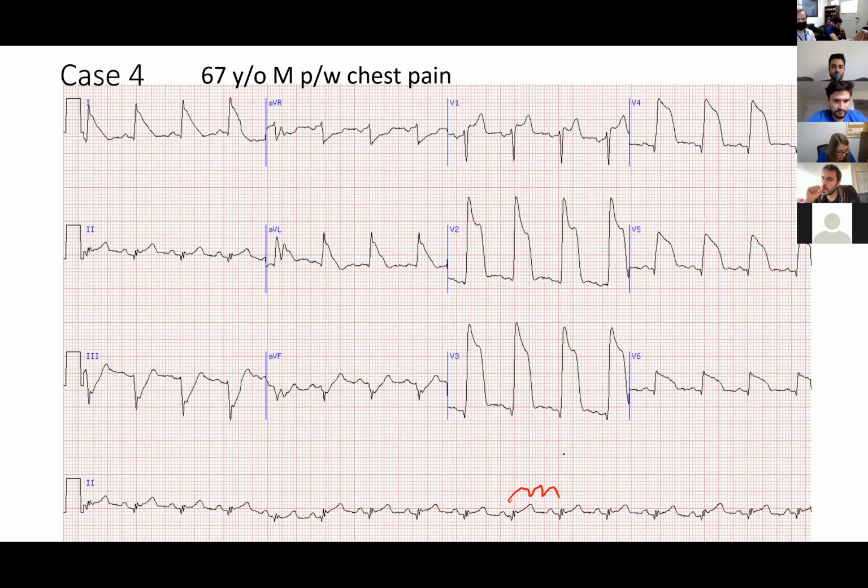And then I see normal sinus waves in 1, positive sinus. Sorry, P waves. In 1, the P waves are normal, and in 2 as well. And in AVR, they are bimodal, kind of, maybe a little larger. In AVR they are mostly negative.